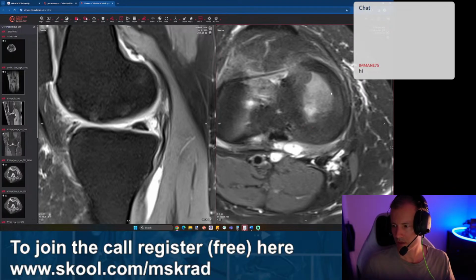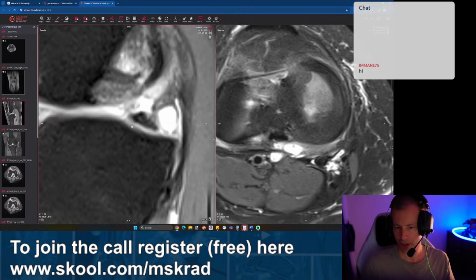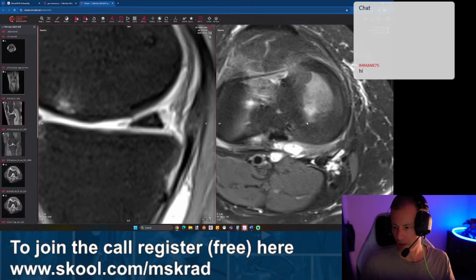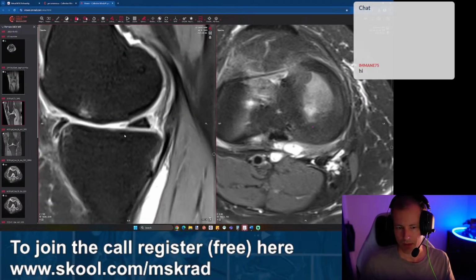You can see the nice smooth border here. Here it's still okay because it's fading out with partial volume, but here the sharp change in contrast means it's not nicely fading out. So that's corresponding here to this truncation that we have here. From here to here, there's a little radial tear. This one might even be a tiny bit of a flap floating around here in front of the tip. We can't really see this any better in this resolution.